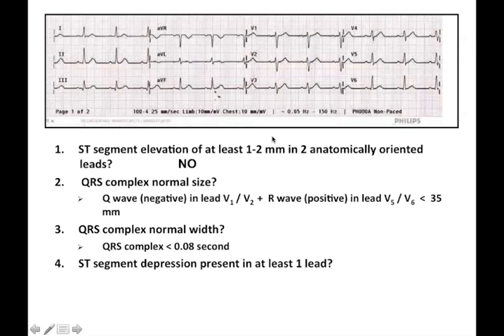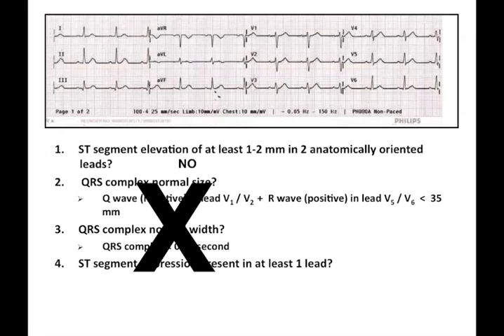Because we answer no to this question, we can no longer use the algorithm and will be forced to diagnose the lack of STEMI in this patient. In fact, this is a normal electrocardiogram. This patient is not having a STEMI. Let's go to another example.